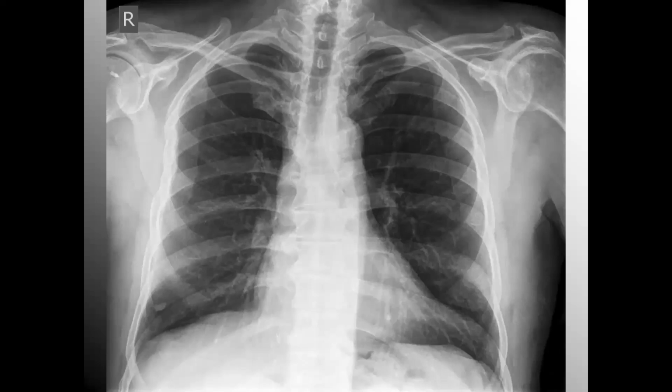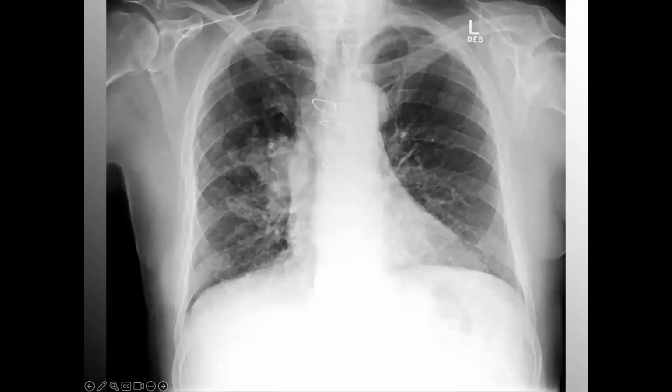I don't see any spiculations, any root-like projections. It's not calcified, but it's a little granuloma in that right lower lobe. Again, we're not necessarily talking about treatment today.